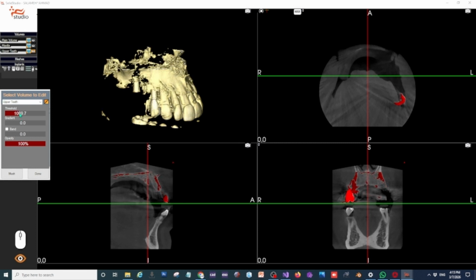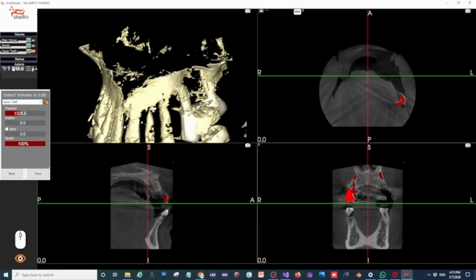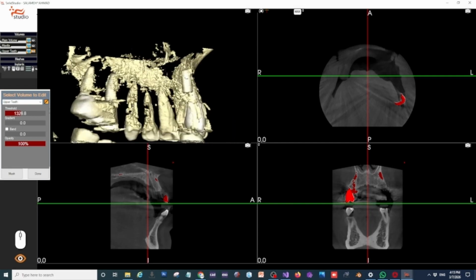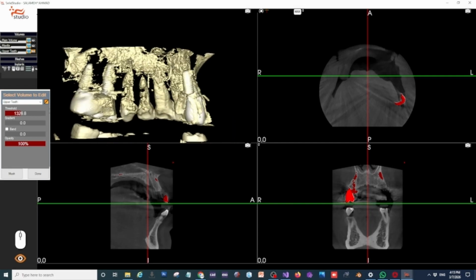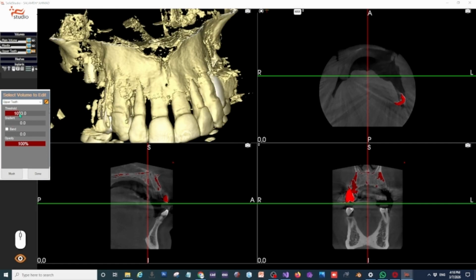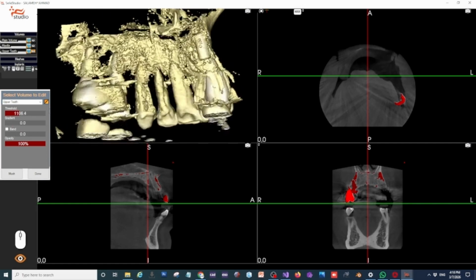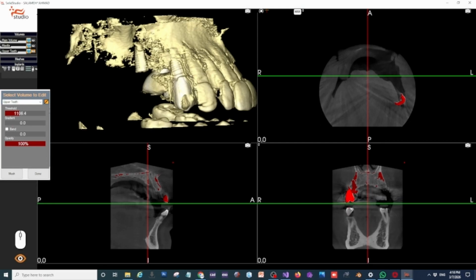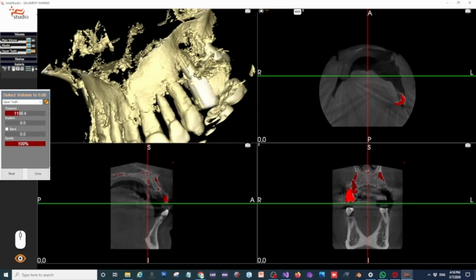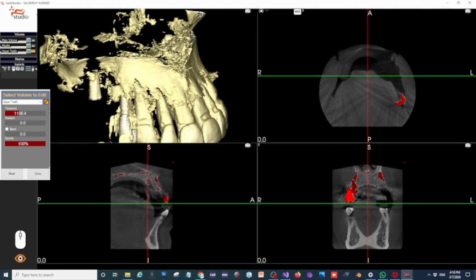With a lower threshold, the surrounding bone remains visible. As you raise the threshold, the teeth begin to separate, though dense bone may still linger. If you raise the threshold too high, you will hide that dense bone, but you also risk losing critical parts of the teeth, such as the root tips and softer dentin. Adjust the slider carefully to find the sweet spot where the teeth are clearly defined before the roots start to appear hollow or eaten.